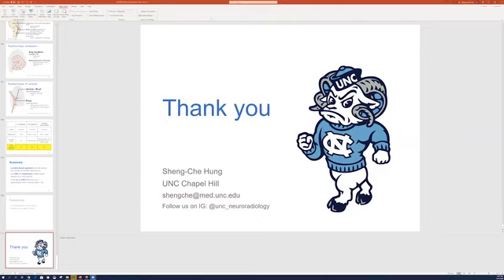One type of ganglioglioma may appear solid, and as I showed in my lecture, they can have some enhancement and could be solid, but it's not T2 very bright like a DNET, so it will be easy to differentiate these two. Another group of ganglioglioma I saw will infiltrate along the cortex with minimal enhancement. Sometimes they even carry some calcifications. So your differential should include a low-grade glioma rather than DNET. In my experience, DNET should be very easy to differentiate from ganglioglioma, but sometimes it's difficult to differentiate ganglioglioma and low-grade astrocytoma in epilepsy patients.